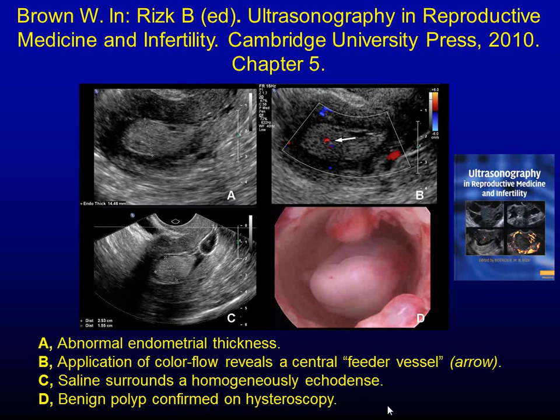So of course this is age dependent. For postmenopausal women you want it below 4 millimeters. For younger women it varies tremendously. So with this thickened endometrium you want to do further evaluation. Should everything be available in the office, it's ideal to do a Doppler. It will show you the feeding vessel that I've shown you in the previous slide. And then if you do sono, the polyp is big enough that it left only a sliver of fluid there, with the majority of the cavity taken up.